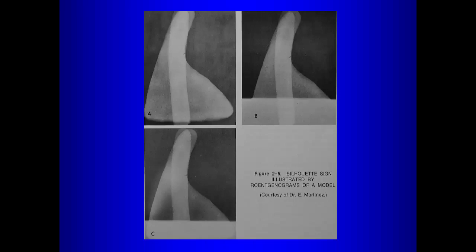So in terms of the basic radiographic densities, starting from least dense to most dense, what is least dense? Air. What comes next? Fat. And then after that we have soft tissue and fluid, which is the same attenuation for X-rays. And then after that we have calcium or bone, right? And then what's denser than that? Metal, right? So those are the basic radiographic densities.